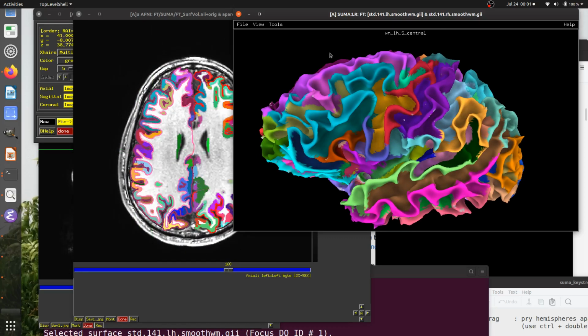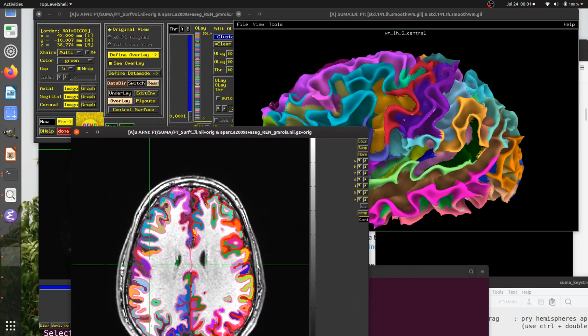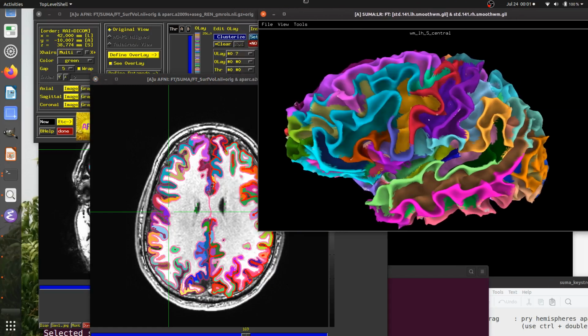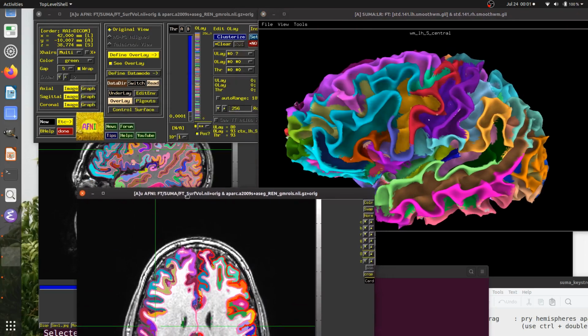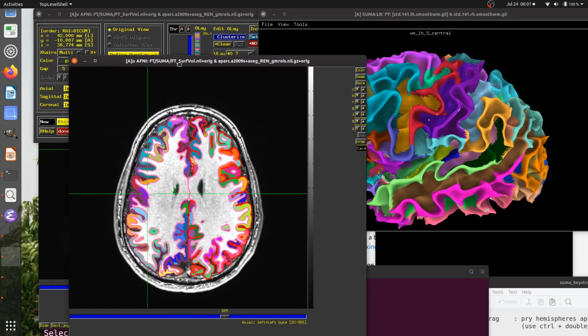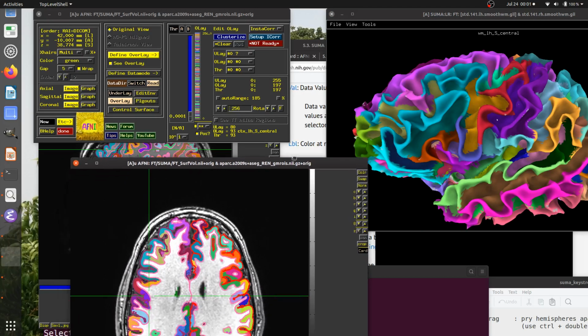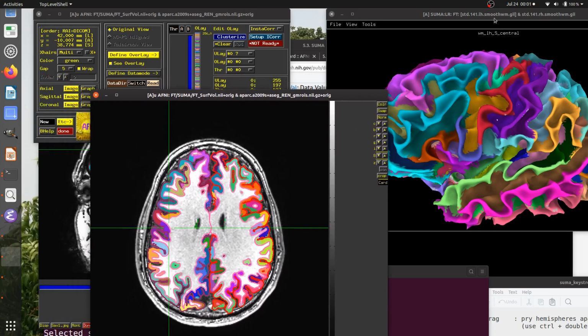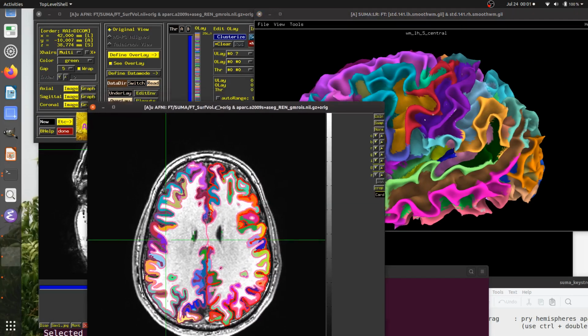But you can see that the colors are still there. I'm not actually sure if I'm looking at the same parcellation data set here, I should have been careful, so I could check if the ROIs match. They should. Yeah, so I think I did happen to fortunately overlay the same of the two parcellations. So the AFNI label is the same as the SUMA label. This is actually the label on the surface data set, not of the colors here. But anyway, these are really there.